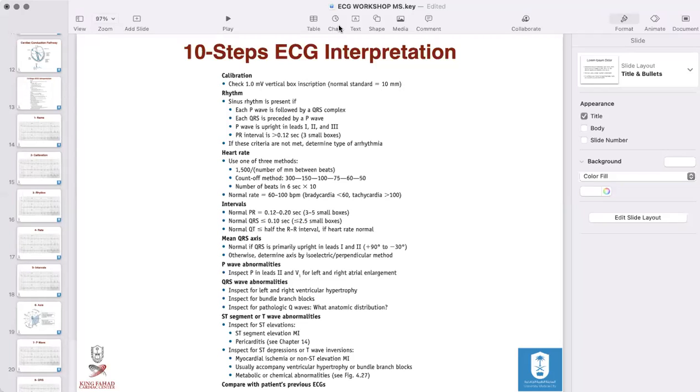There's a question by Sultan. Does the U-wave have importance in ECG interpretation? Yes, sometimes it's found in the ECG. Sometimes you can't see it. It can be part of a normal variant. Sometimes it's abnormal, or it's not a U-wave, it's something else, like Osborne waves, which happen in hypothermia. And we're also going to talk about it when you analyze the ST segment and T wave abnormalities. Whenever you analyze the T wave, you're going to analyze the TP segment with it.